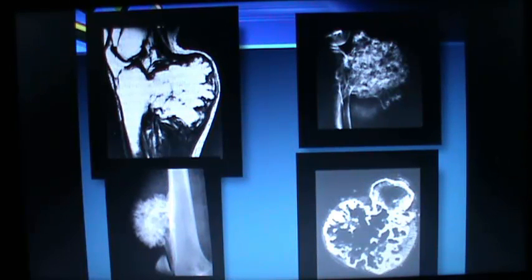Being osteochondroma, that means there is chondroid tissue. It can present the famous flecks, arcs, and rings, and mottling of calcification within chondroid tissue, as in this case. See the skin bulge and muscle stretch, muscle weakness, muscle atrophy, and the same can result in nerve stretch or vascular block.